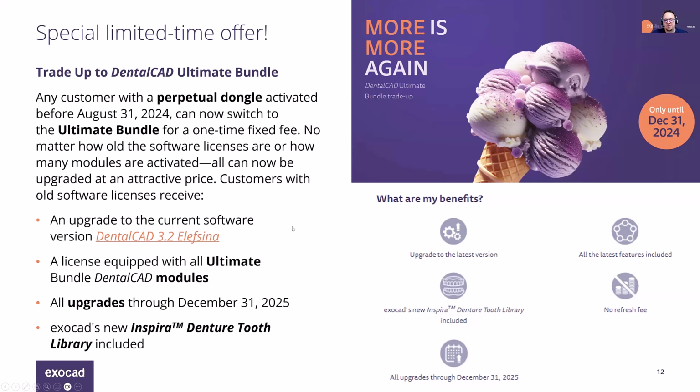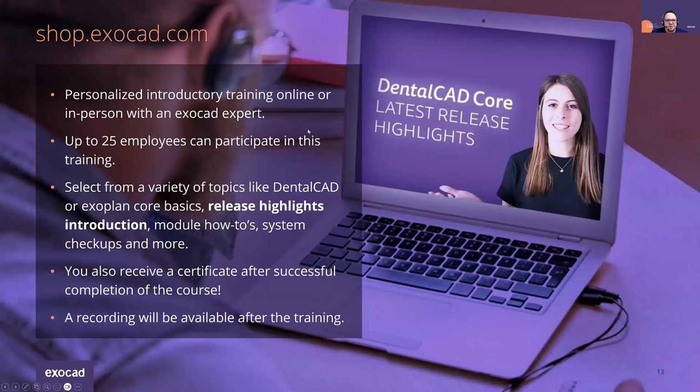And the new denture tooth library for exocad that we've now released is called Inspira. There are a lot of different bite classifications with this and presets that really streamline the design process and can increase productivity.